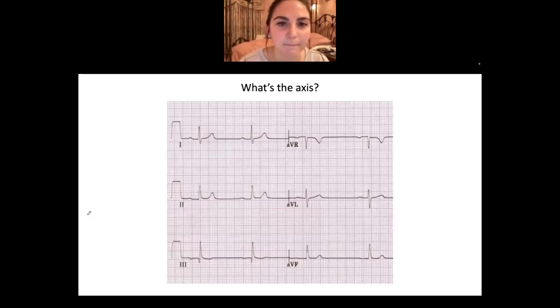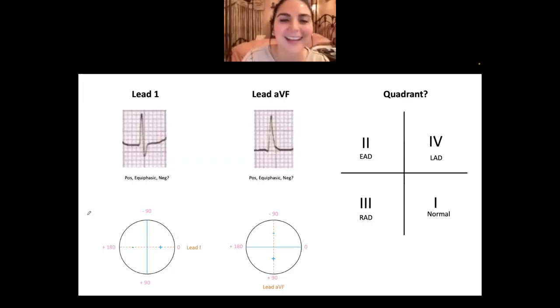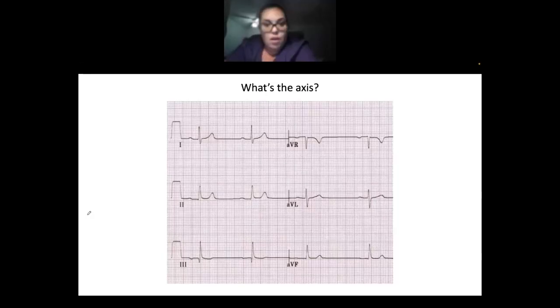Very cool. All right, y'all, what's the axis? Here, I'll help you out. No, actually, I'm going to make you guys do it on your own. This should be normal. What'd you say? Said normal. Okay. A vote for normal.